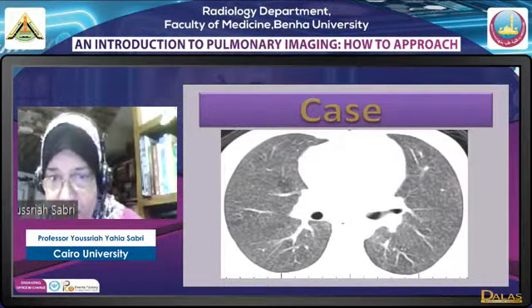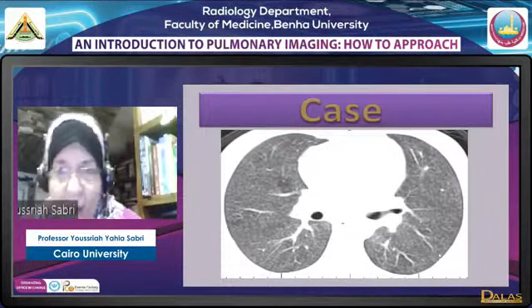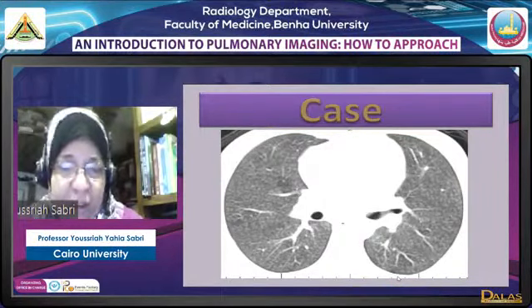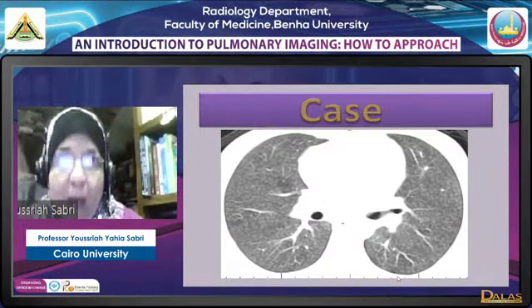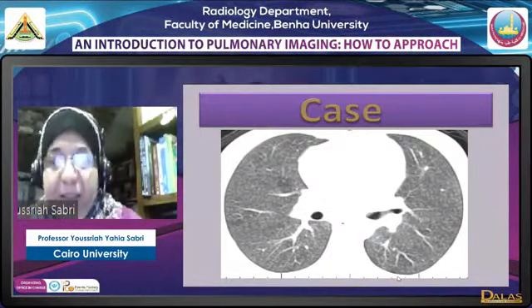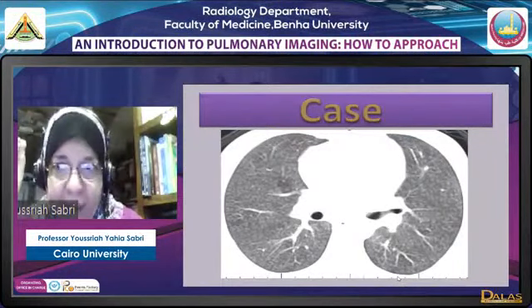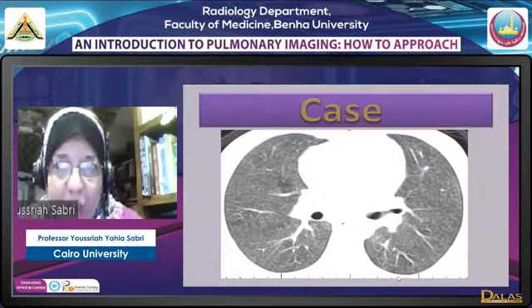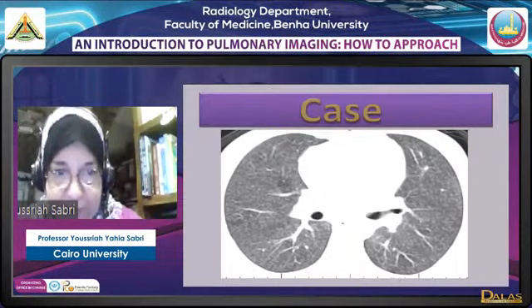You can hardly discriminate the fissure. And these numerous centrilobular nodules that you will see filling the whole lung, with relative basal sparing, are specific for one of the appearances of subacute hypersensitivity pneumonitis.